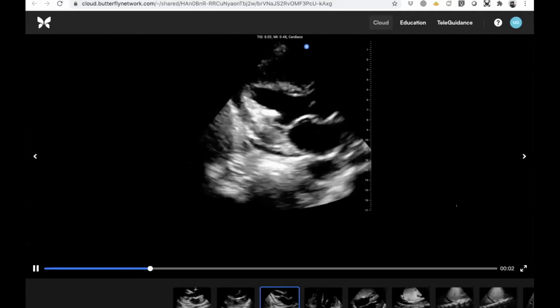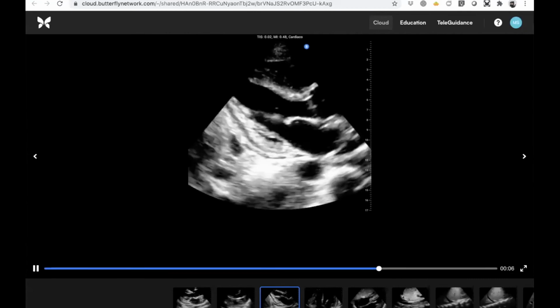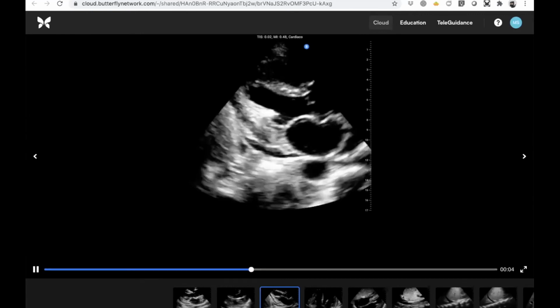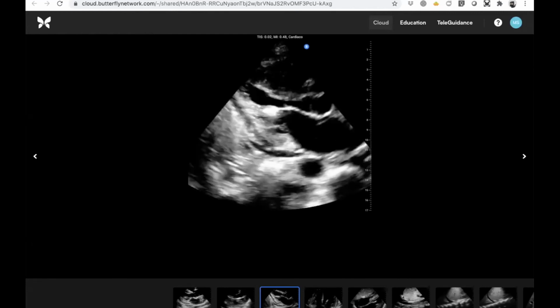Eric Martinez, who sent us, with patient consent to share some clinical details, some images from a patient with AIDS and a recent fungal pneumonia. So here is, and there's probably a select few participants who will get the snarkiness of the comment I'm about to say to Rachel. But Rachel, this is an echo in an orientation that you guys do reversed at Yale.